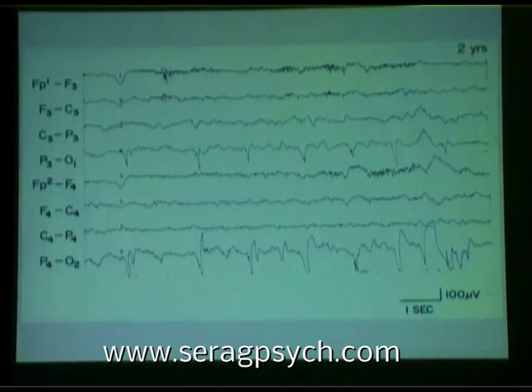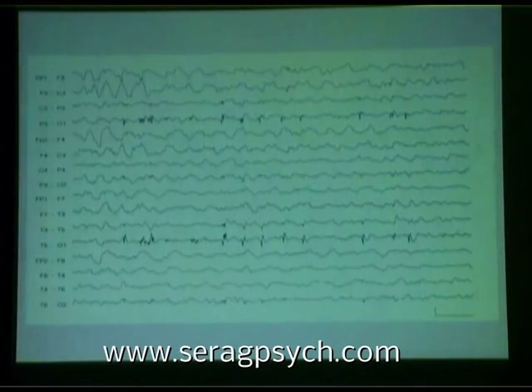And that's our boy kicking. I think I've shown you that 2 times already, so we won't do it again, except to show, again, huge discharges here from kicking at O2, no spread at all to P4, which doesn't happen. Next. And there's another example of practically the same spikes I was showing you before, and how varying in their morphology, and how often in sleep they can have polyspikes in the same burst.